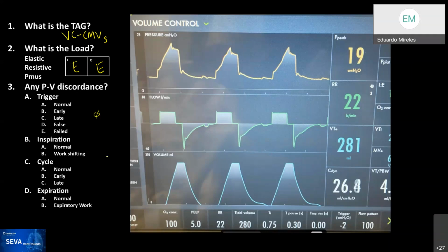Love it. Alrighty, and so I'm going to put here a question mark, Udi question mark, or unmentioned fellow question mark. So now here we are. There are these little divots that are occurring over here. You can see them here, and you can see them elsewhere. Now, what do you think about the pressure waveform?